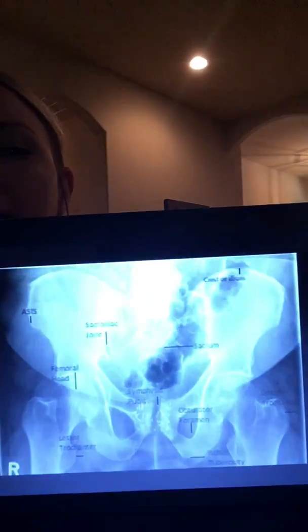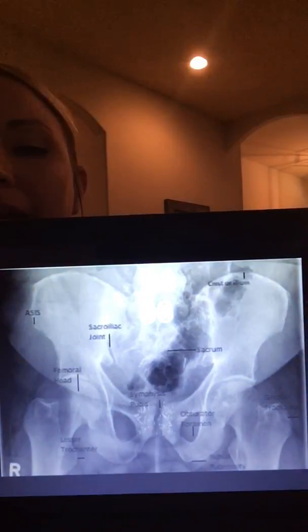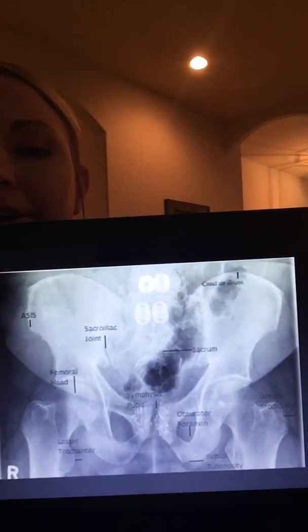Now the findings of these x-rays were that the gentleman was just experiencing pain that unfortunately is associated with prostate cancer. Lower limb pain and swelling, and pelvis pain is just part of the symptoms of prostate cancer. I'm going to show you my image one more time here. Do you know what these are right down here?